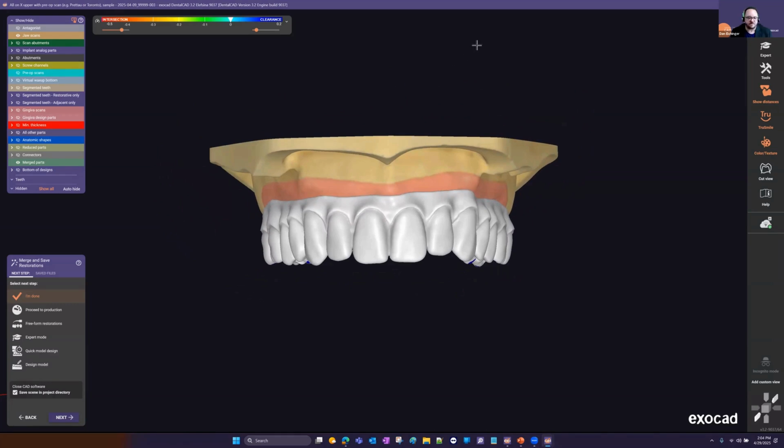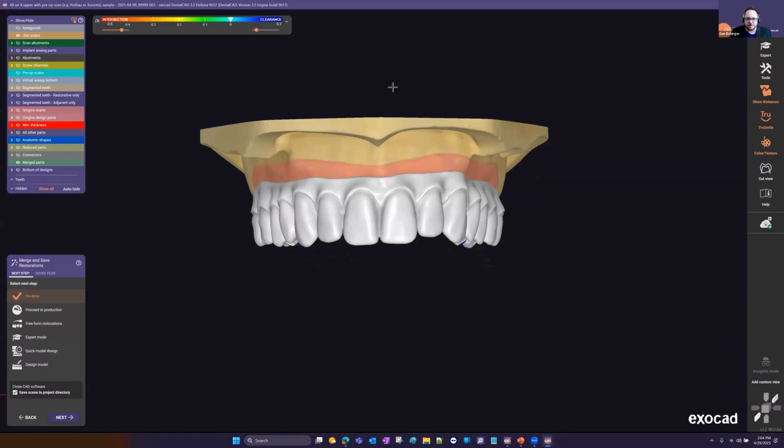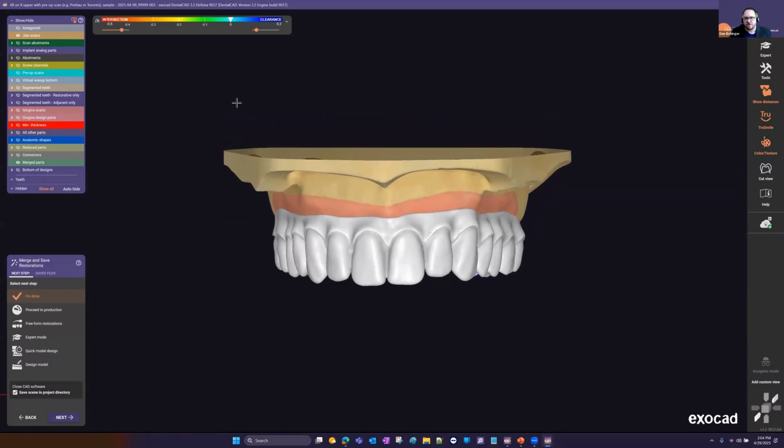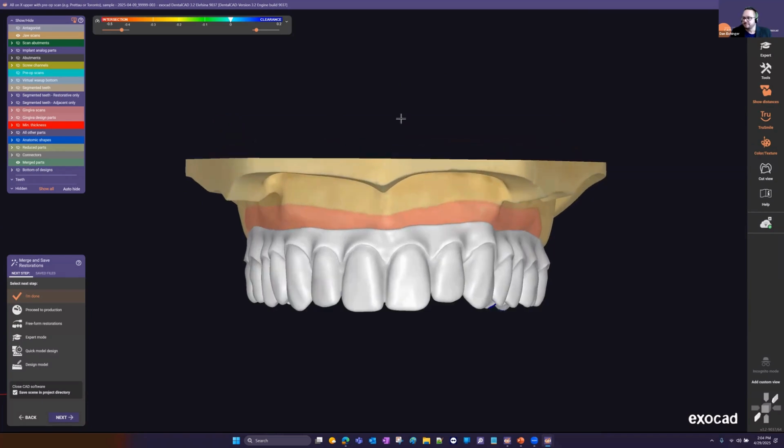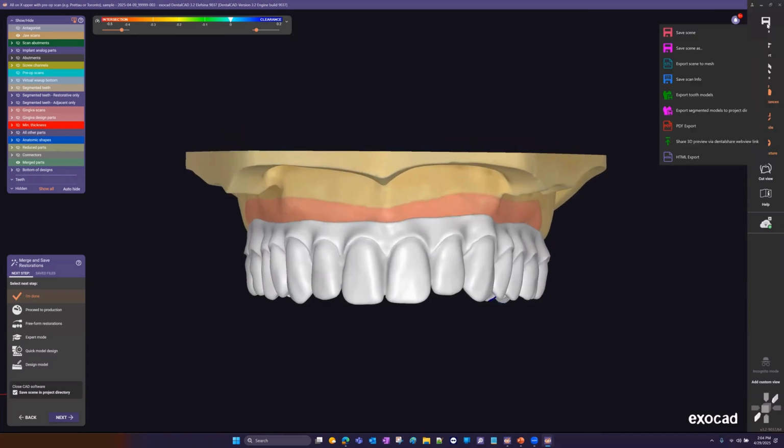But yeah, with any other scanners that are more locked down, in a similar aspect to where they're part of a CAD/CAM ecosystem, you might have to export them as an STL file, depending if they're utilizing a proprietary file extension or file type. But their scans are importable into our software. So when you open the software, you just load in whatever scan for that patient. Jim says thank you, by the way.